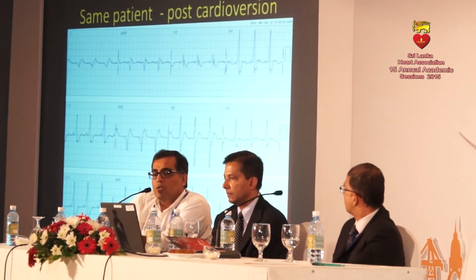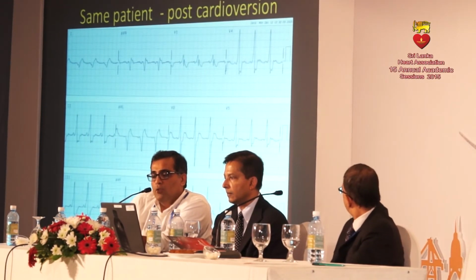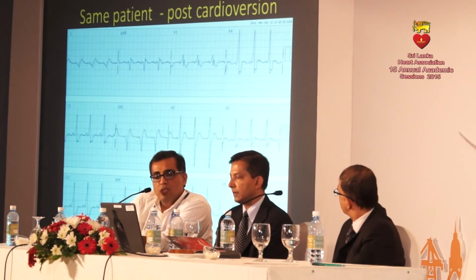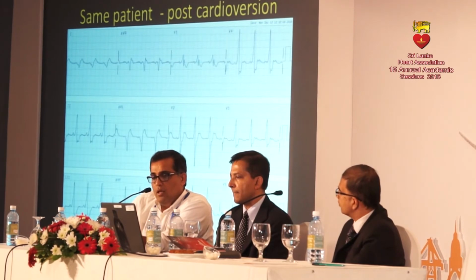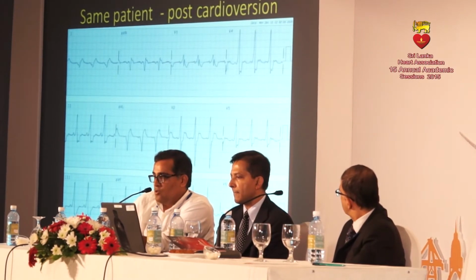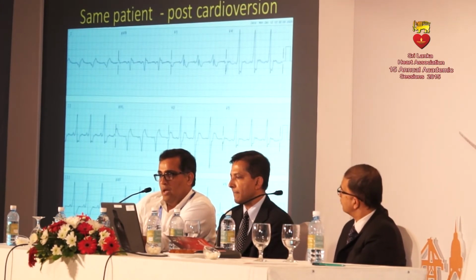There are positive delta waves in V1 all the way through V5, V6, and you have a negative delta wave in 1 and aVL. And you would think that the delta wave should have been negative in 2, 3, aVF as well, because your point of activation of the pathway here is the left posterior base, right?